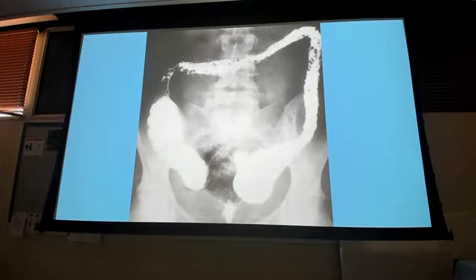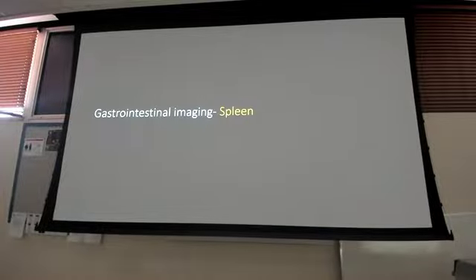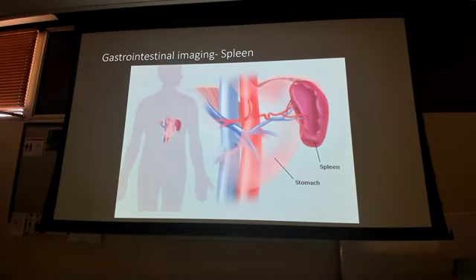What do we call that based off of the things we looked at? No, not that. Yeah, ulcerations. Ulcerations all throughout here. Probably ulcerative colitis, to be honest with you. That's probably what that is. But yeah, ulcerations. Questions on the bowel again? No. Okay. Spleen. There it is.